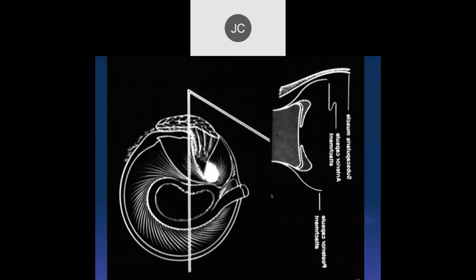If we take a cross-sectional area, like on our axial images, here's the subscapularis muscle and the tendon, which attaches to the lesser tuberosity, as you know. Then we have the capsule here, and a thickening in the capsule in this location is the middle glenohumeral ligament. It typically goes from superior inferiorly down, and then it really attaches to the deep subscapularis fibers, as we'll talk about. And there's the anterior labrum, posterior labrum, and then there's the posterior capsule back here.